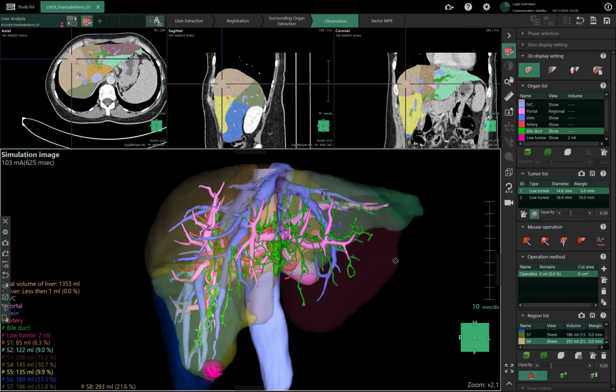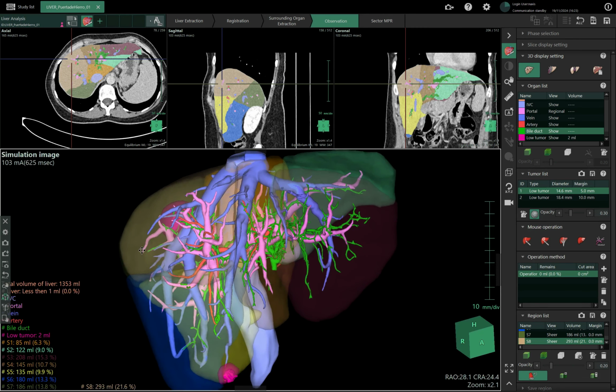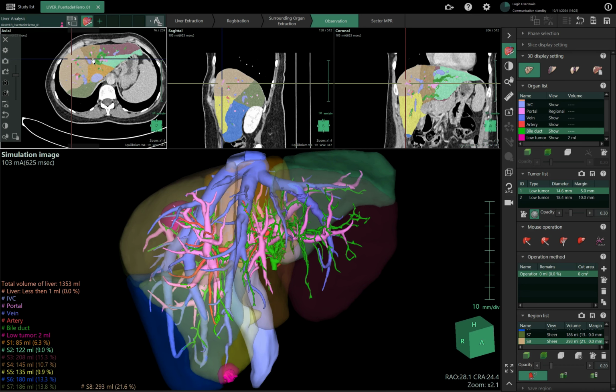Yeah, but the thing here is that maybe what is displayed here as bile duct is the fatty part that is painted in green. Maybe precise, maybe, or maybe not. We are not 100% sure. I'm quite sure, but anyway, I can't sign off on anything else.